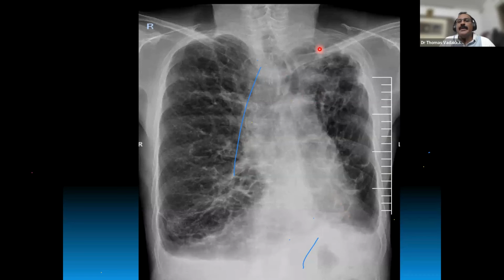So there is a pleural thickening on the apex, crowding of the ribs. So there is a cicatricial collapse of the left upper lobe. You can see fibrosis over here. There is a pleural thickening on both the costophrenic angles. So many findings in this X-ray. So this must be a post-TB sequelae with infected bronchiectasis of the left lower lobe and upper lobe.